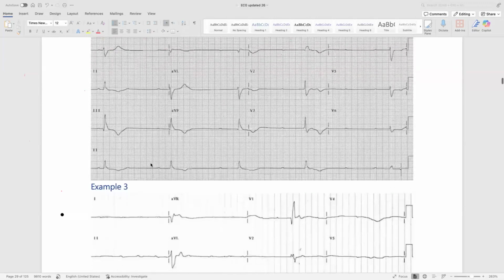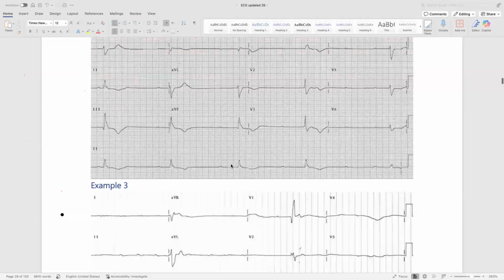So don't say, here there is more prolongation and a drop. Very severe bradycardia. This is not a Wenckebach.